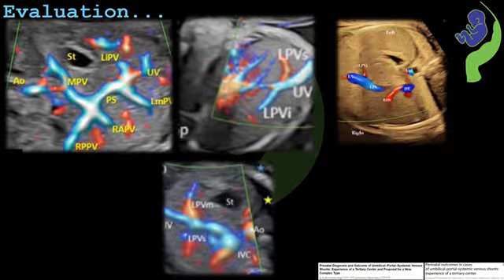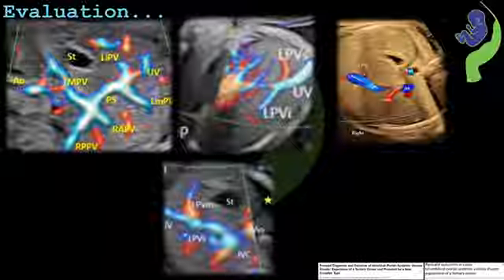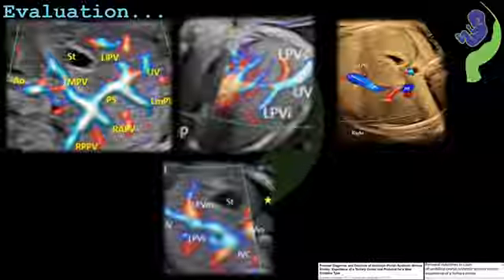If you were able to identify the variation in the branching pattern of the portal vein, then the objective of this video is already achieved. Recognition of these normal variants is the foundation for confidently detecting any deviation from the normal. In the upcoming part of the series, we will focus on the abnormal patterns of the umbilico-portal venous system, and also how to diagnose them and how to classify them correctly.